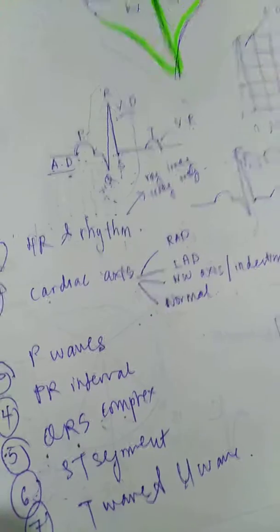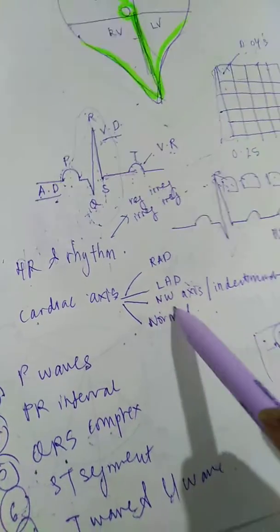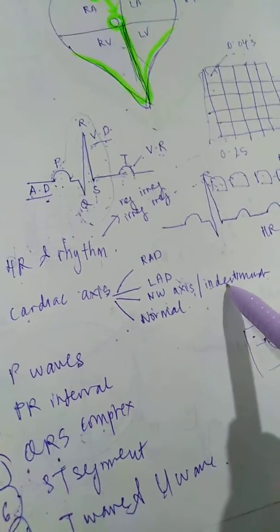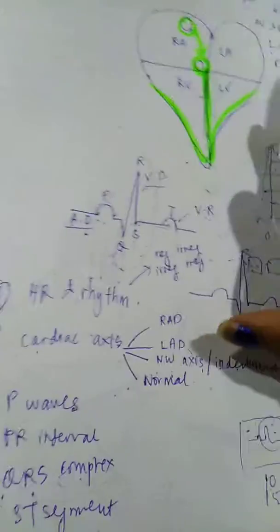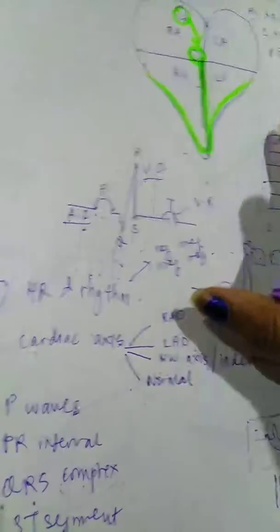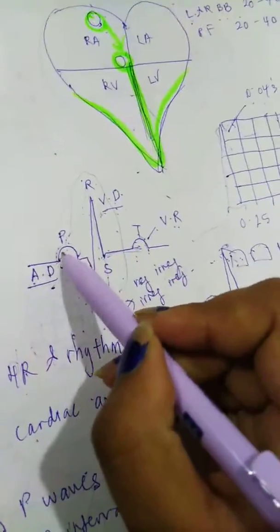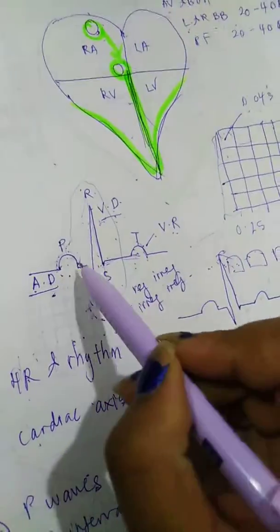Okay, so in lead 1, the QRS complex will be facing upwards, which is positive, and then you see the aVF is negative. So literally they move away from each other, they left each other, in another word. A simple way of remembering: they literally left each other, so therefore they are left axis deviation. And the causes of LAD are usually just the opposite of RAD.